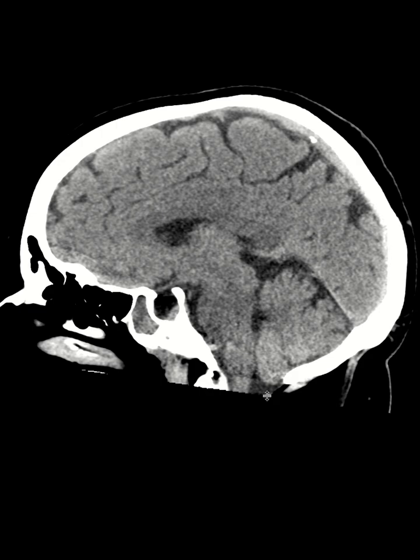There is only one diagnosis, which is idiopathic intracranial hypertension, or IIH. Nowadays, it's a very common diagnosis, specifically in people who are overweight or obese, and they usually present with headache, and most of the time these patients go underdiagnosed for many years and they suffer. So imagine that as a radiologist, you flag this to the referring physician, and they can go from there and get good care.